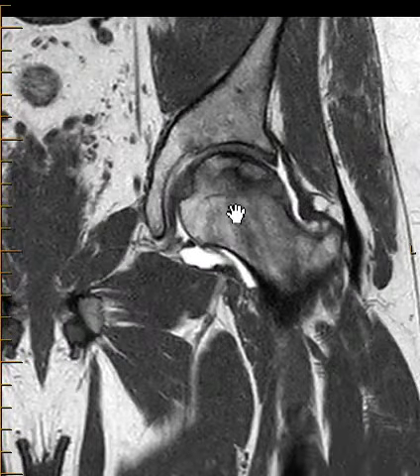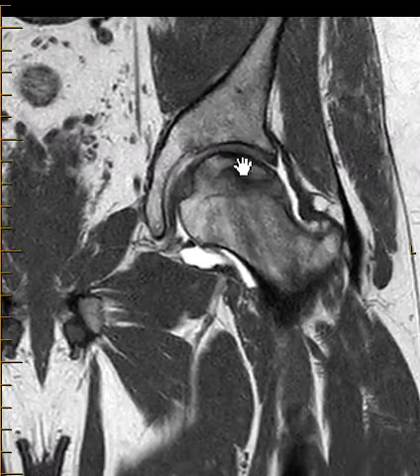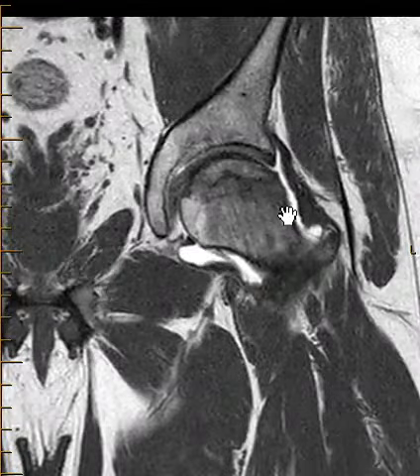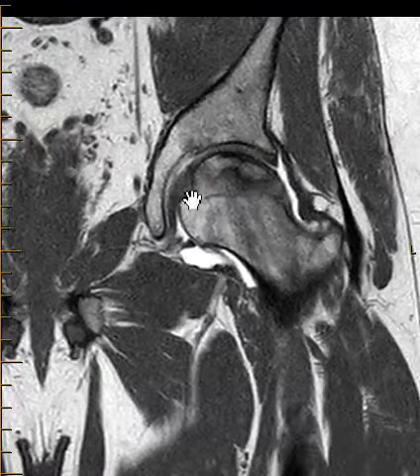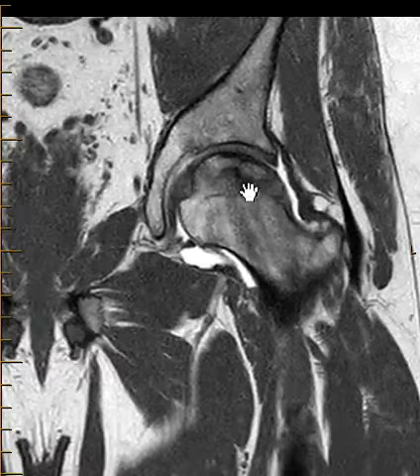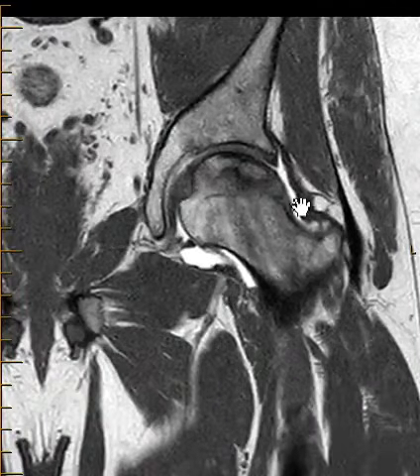This is classic for avascular necrosis or osteonecrosis, where the bone is infarcting, doesn't have a good blood supply, there's too much pressure in there and the blood can't get to the bone. And so this is AVN or avascular necrosis, and we're catching it early before the femoral head has collapsed. Sometimes they can do a core decompression where they go in there and decompress the bone, give it room, and hope that it can revascularize. And if that doesn't work, then they may need to just replace the hip.